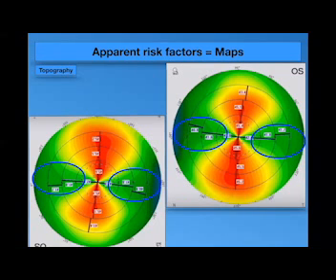So if the difference between the superior point and the inferior point is less than 1.5, you can consider that this topography is within normal. If more than 1.5, you will consider this topography abnormal or atypical, because there is inferior steepening with a difference of more than 1.5.